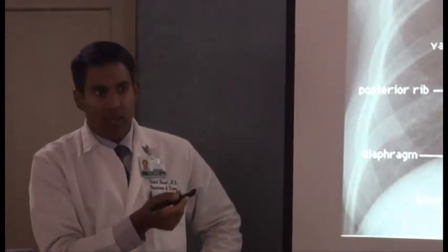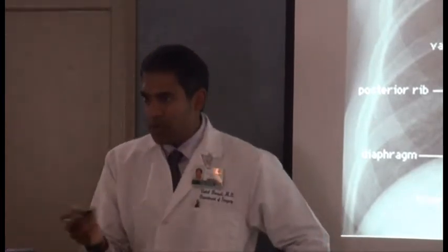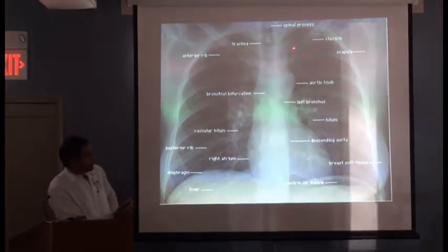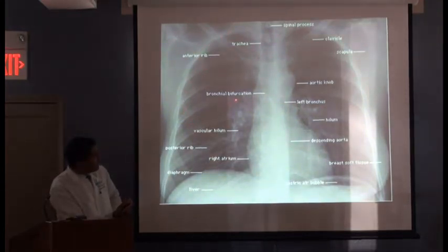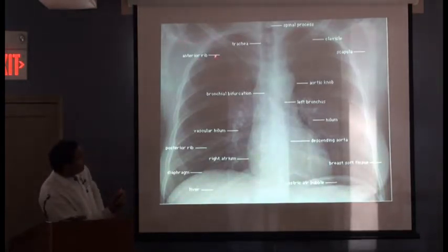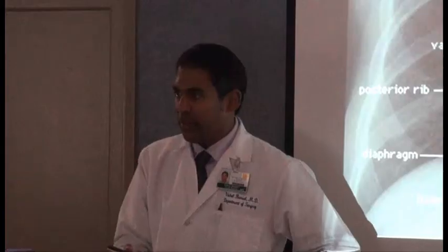All right, B, just to make it easy, we look at bone. So what we can really see in a chest x-ray bone-wise, we can look at the clavicles. We can look at the ribs. These are the posterior ribs, and they're starting to come anteriorly here. See that? Posterior ribs starting to bend anteriorly. And then sometimes we can see little things on the actual T-spine itself. Also, we can sometimes see the scapula. See the scapula here? Here's the edge of the scapula. So we look at bone very quickly.